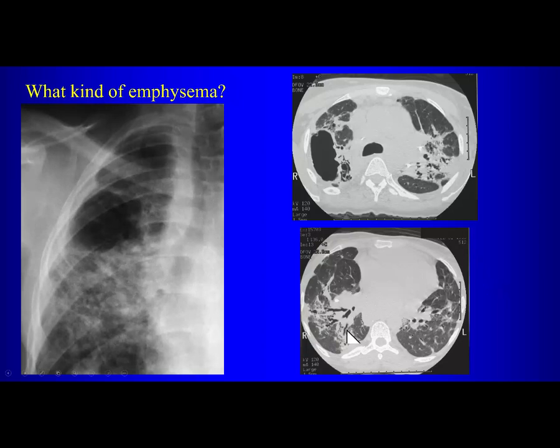Do you think this is neoplasm? Is that cancer? What are those opacities? What kind of bronchiectasis do you see? Traction bronchiectasis.